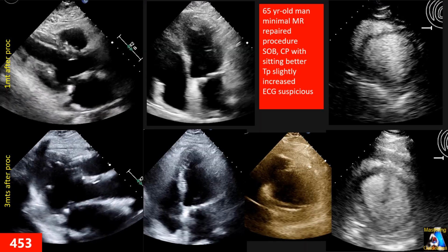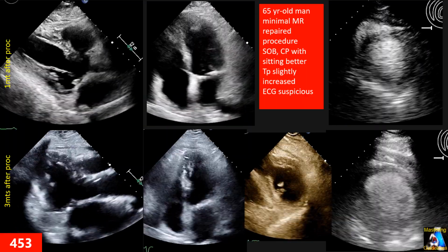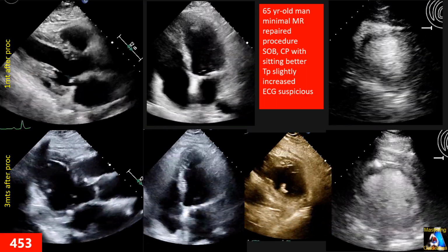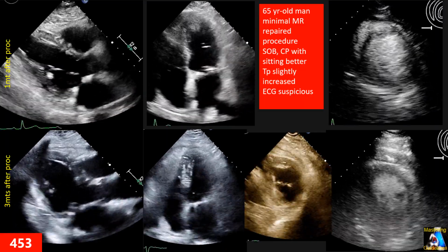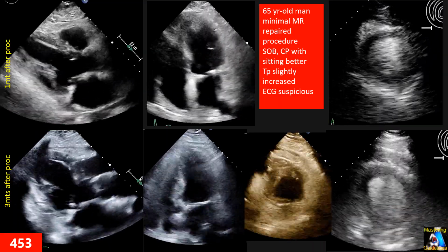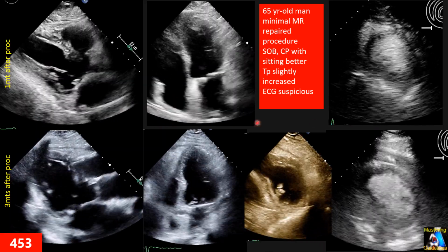Hi everyone. In this interesting case study, we are going to learn about one of the uncommon causes of wall motion abnormality, not due to ischemia, and another important type of diastolic dysfunction too. Now let's go to our case study.